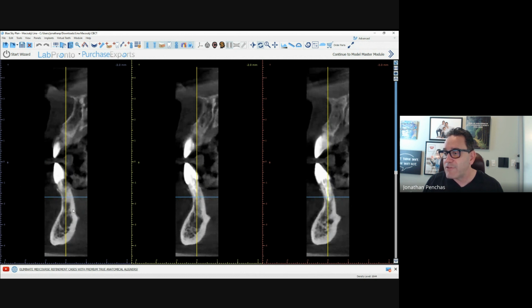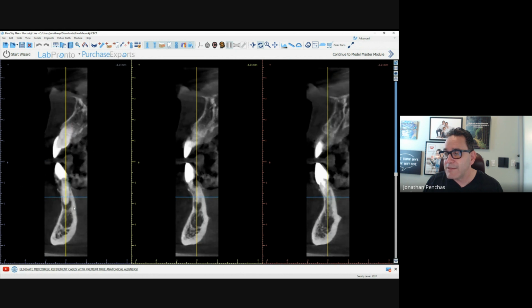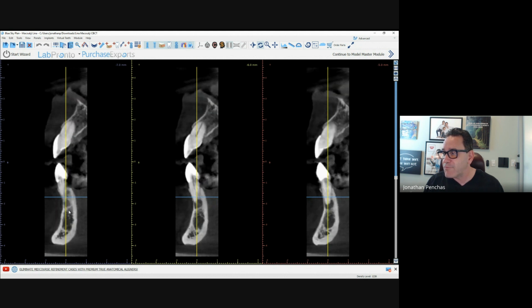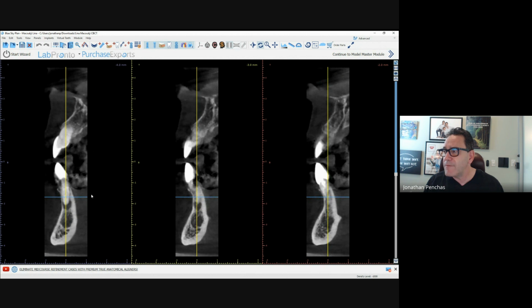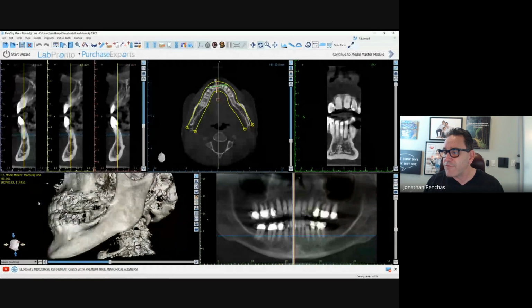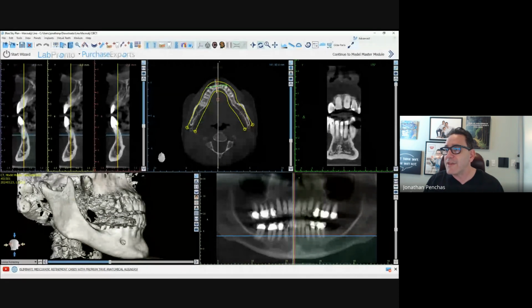Now, you all know that if it's penetrated the buccal plate, the chances of endo being able to fix it without an apico are lower, not no chance, lower chances, and that's well documented. But if the buccal wall is still intact, your chances of doing endo and succeeding are higher. So this is a very good diagnostic tool for telling you your chances of success of performing endo. So great. We found on Dr. Saab several problems, several ideas. We're going to open another case to see some other things that we can find on anatomy.